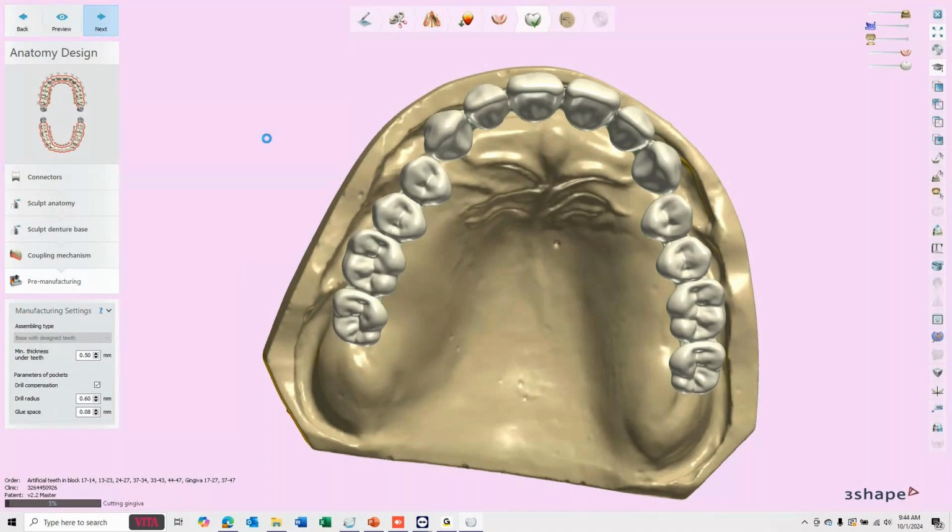The last part I want to show you is you can see the symbol up here at the top of the dent disc, like we set it up as. It'll actually show these in the disc itself, so that you can kind of visualize how they'll fit into the blank, and kind of where those disc layers are, because the dent disc is a multi-layer disc.